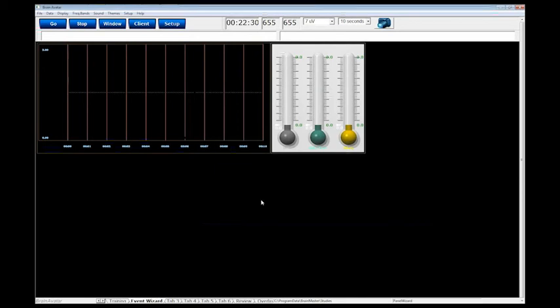So now, for future people, I have a design of something that is for me, by me, that will work for my patients later. And you have control over a lot of these different features. This is the main reason we wanted to show you guys some of the different things that you can do with it. It's really limitless, and as I'm getting close and I wanted you guys to be able to ask some questions, I'm just going to stop right now, as this is the first one, and I will let you ask any questions that you have about what I covered today.